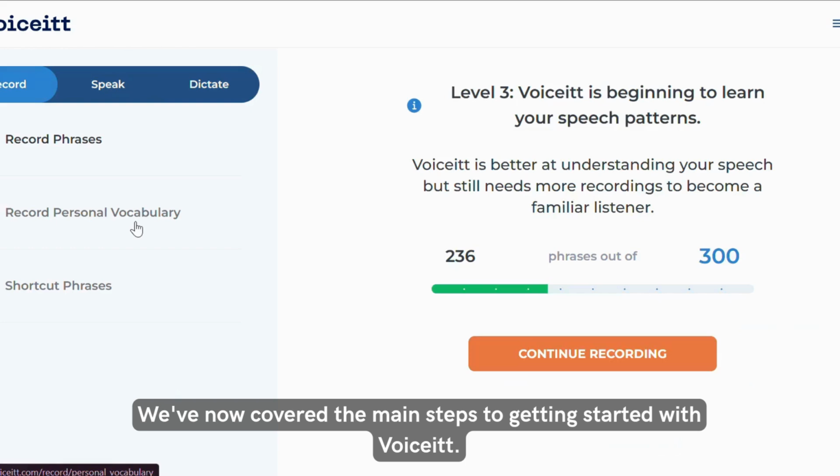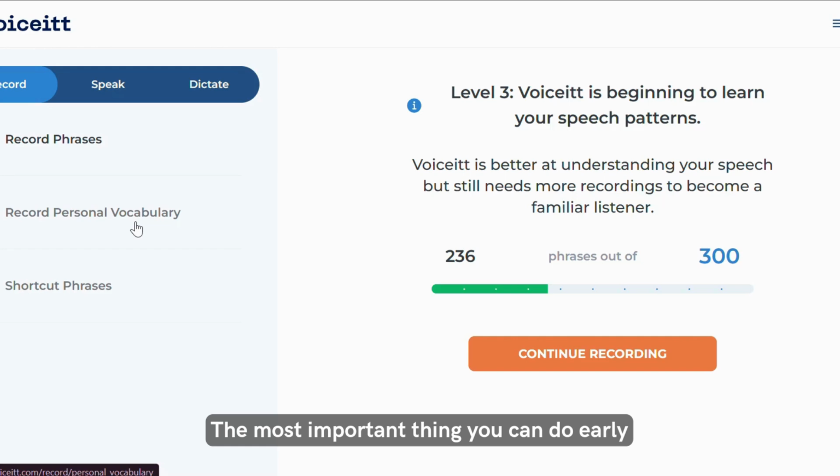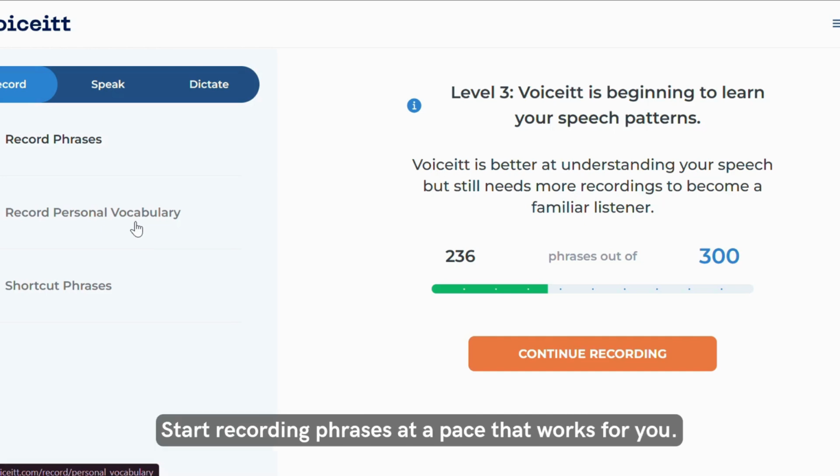We've now covered the main steps to getting started with Voiceitt. If you haven't already, create your Voiceitt account. The most important thing you can do early on is to complete your voice training. Start recording phrases at a pace that works for you. Remember, training does not need to happen all at once. A few minutes of recording each day can add up over time.